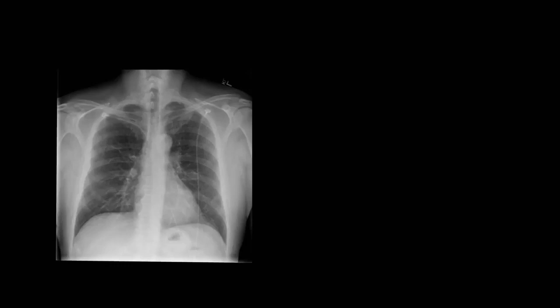It may have happened so fast that you did not notice it, but when I removed the film from the detector stand, I flipped it around horizontally. The consequence of this is that the left side of the film, as we are looking at it, actually corresponds to the right side of the patient, and vice versa. This puts the X-ray in the same orientation as if we were standing in front of the patient and looking directly at him or her.